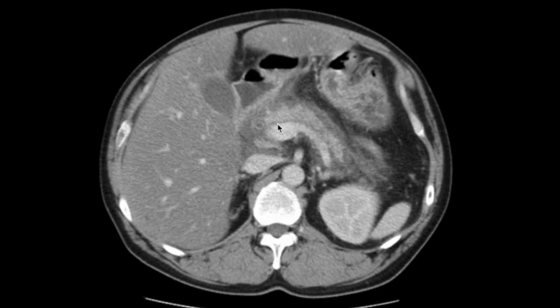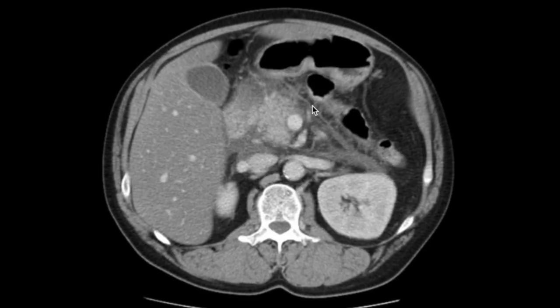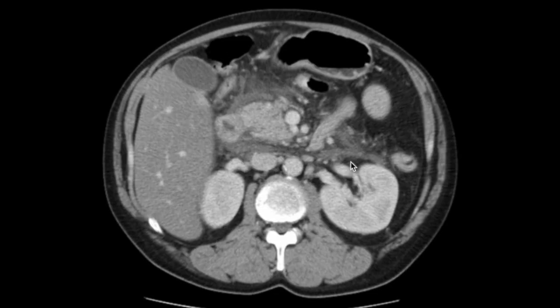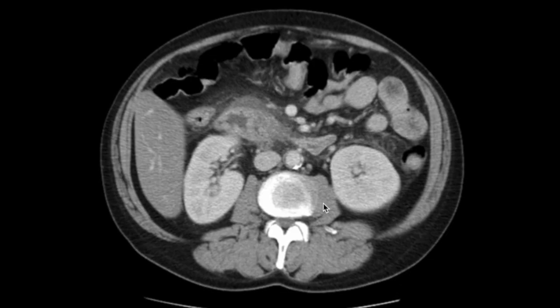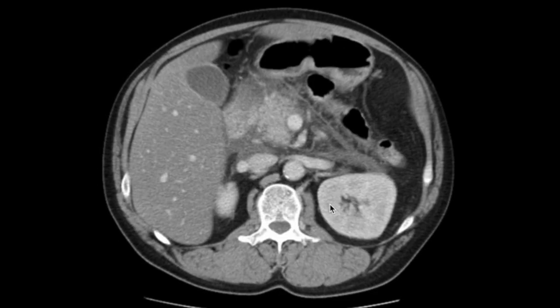Now, let's take another look at the CT image, where the bright signal around the pancreas reflects the inflammation of pancreatitis. Inflamed areas collect fluid as exudate, and blood flow increases to deliver repair cells and immune cells like white blood cells, making the region appear bright. On CT, visceral fat looks dark, so when inflammation increases the amount of gray-appearing water, or blood, the area appears brighter. Let's compare different images of pancreatitis.